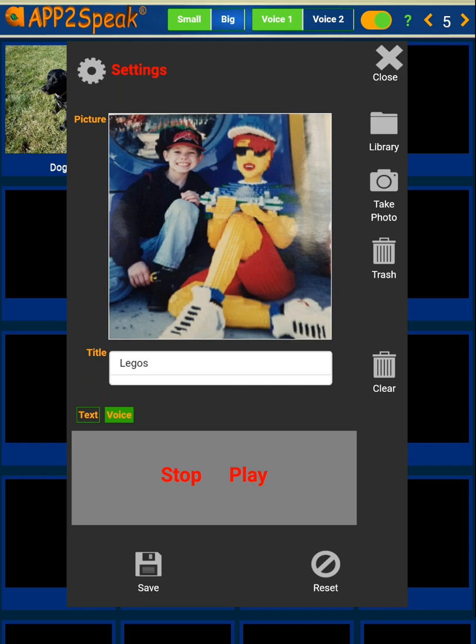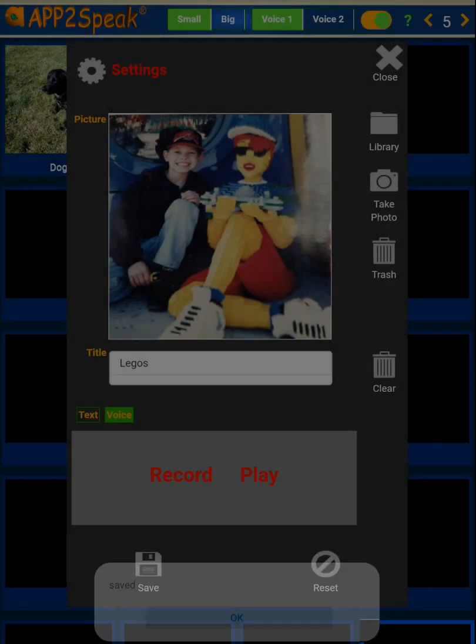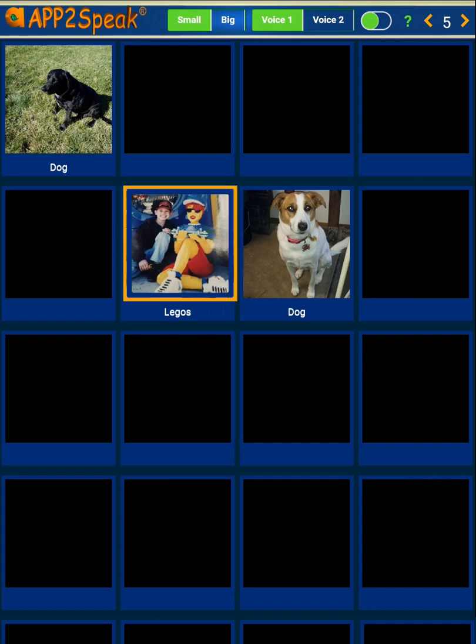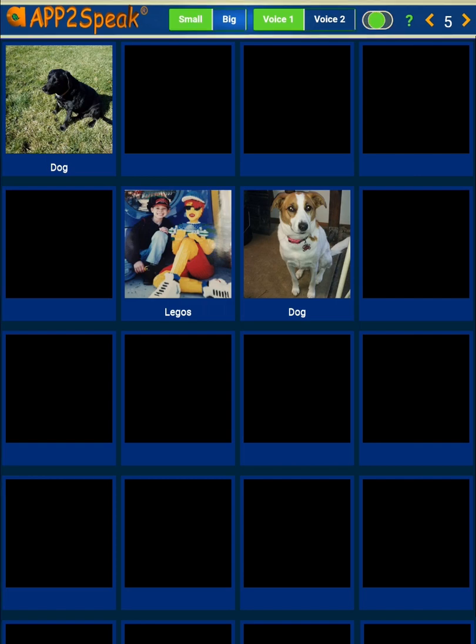My son loves Legos. Make sure you stop. Hit save, and then OK. Then close out. Play back your personal voice. My son loves Legos.